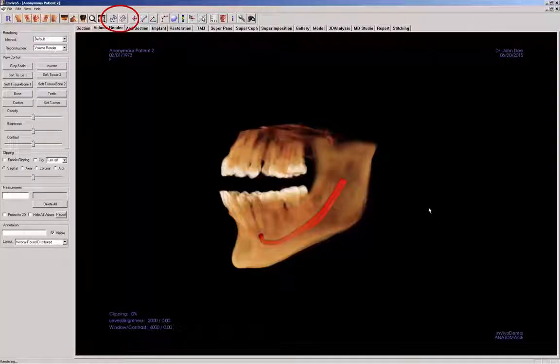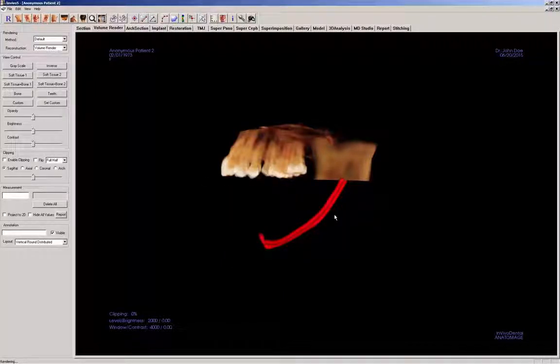The Polygon Sculpting tool will outline an area when you place a series of points and right-click when you are near the first point to enclose the desired area. The volume perpendicular to the plane of the screen will be removed. The volume inside or outside the selection may be chosen by clicking in the respective areas.